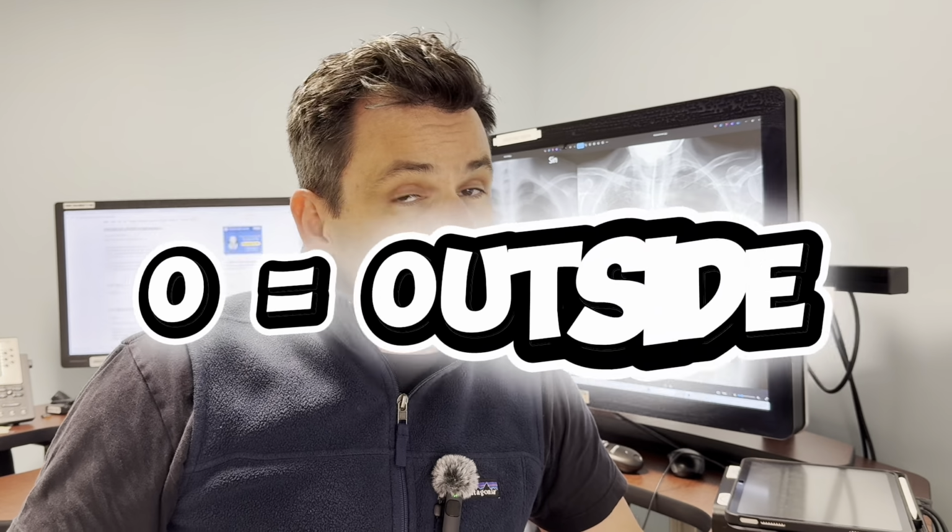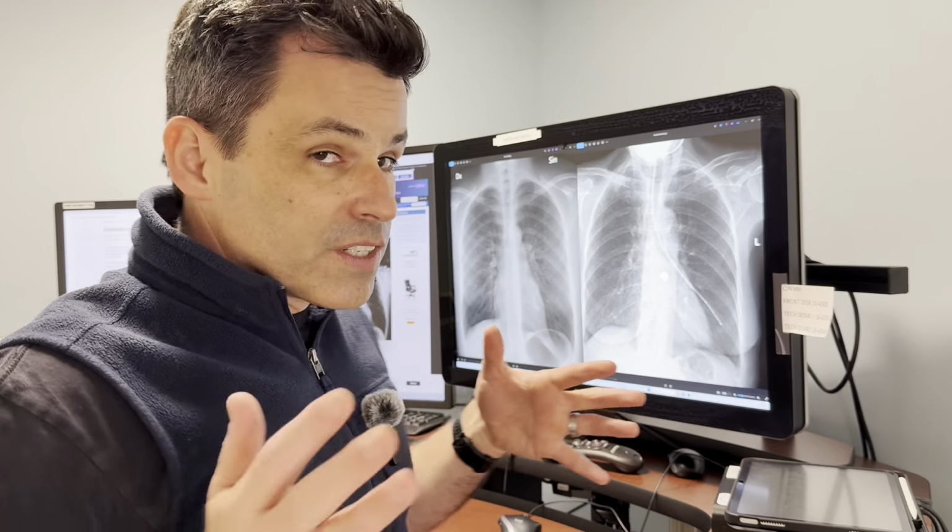Okay, now it's time to start reading the actual anatomy and pathology on a chest x-ray. The next part of the acronym is O, which stands for outside, and this means everything outside of the lung cavity. This means soft tissues, bones, and abdomen. While a chest radiograph is technically a study looking at the thorax and the lungs, there is a lot visible on a chest radiograph that needs to be interpreted.